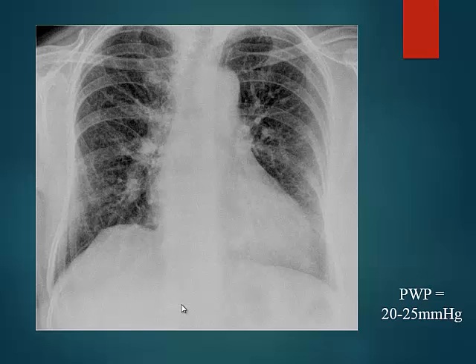So now let's take a step further. This is another X-ray here. Now pressures have increased slightly. They're more than 20, but less than 25 millimeters of mercury. So what are we seeing on this X-ray?